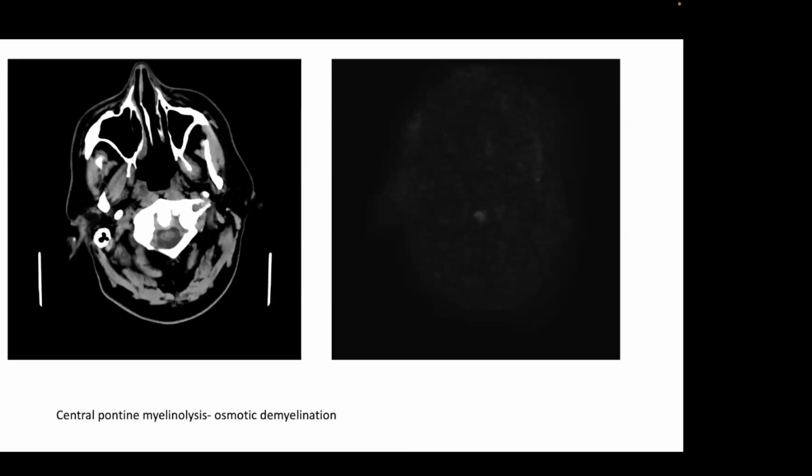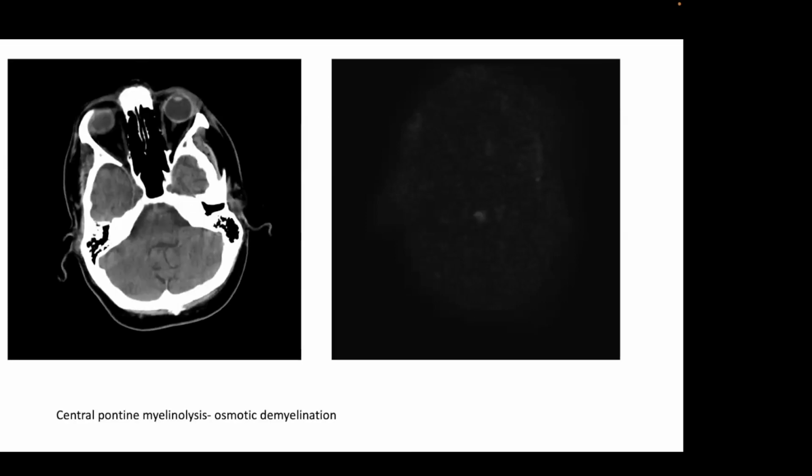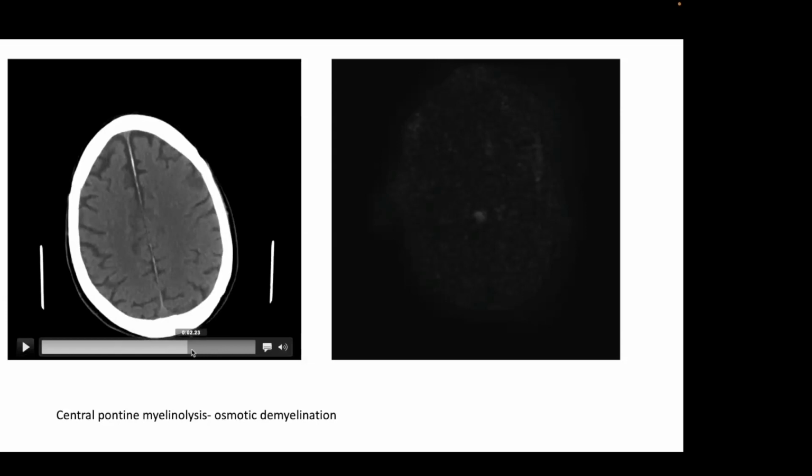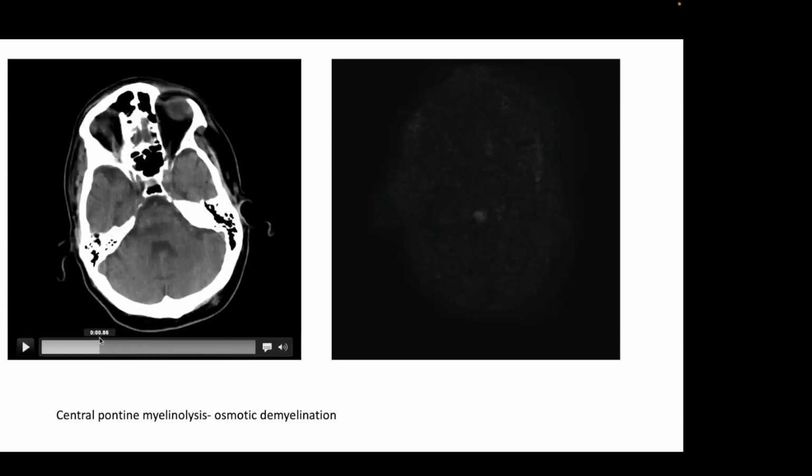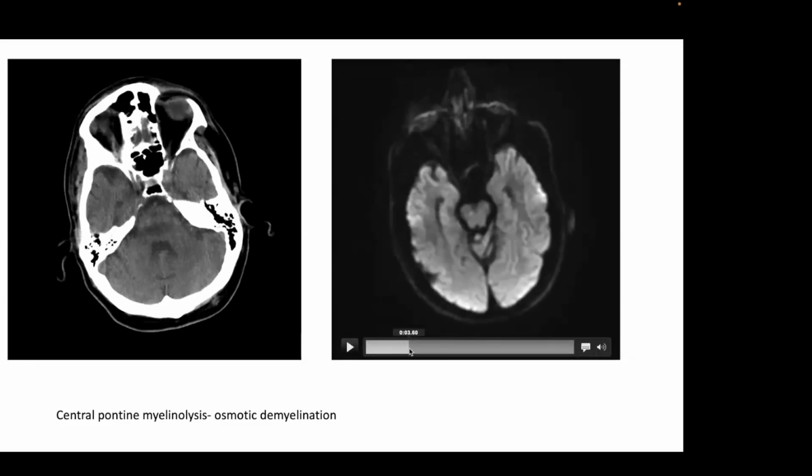This one I want to show you, this patient, if you look carefully, you'll see this low attenuation here in the pons. And again, I would attribute this all to beam hardening on the CT scan. But this was done just shortly afterwards.